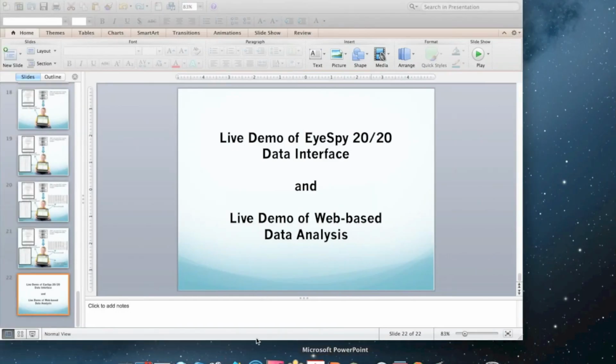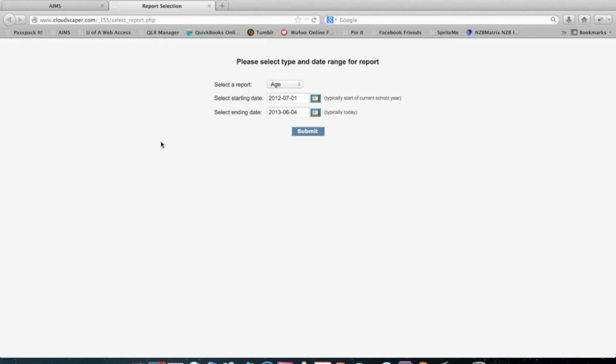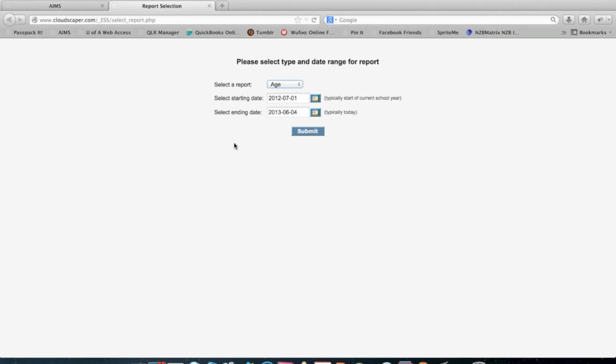Eventually, this interface that I was showing earlier, which can be run on a Mac, in fact, I am on a Mac right now, will give you the ability to pull individual reports, and it will look similar to this, but I have not built that yet. But this is the start of it, which is really what the individuals at the higher levels are looking for: aggregate data, the macroscopic results that are being achieved.